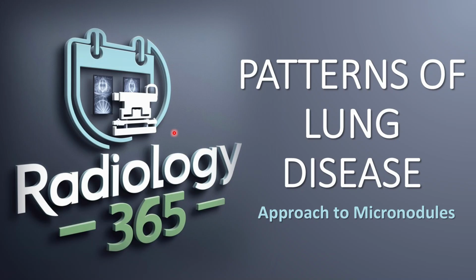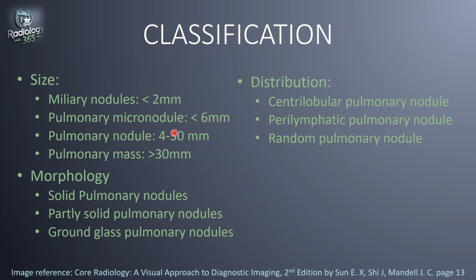And in this topic, we're going to talk about patterns of lung disease, approach to micronodules. Now, when we talk about micronodules in the lungs, they can be classified based on their size, their morphology, or their distribution. When they are less than 2 millimeters, we call them miliary nodules. When they are less than 6 millimeters, they are micronodules. Anything less than 3 centimeters is considered a nodule, a pulmonary nodule. Anything more than 3 centimeters is called a pulmonary mass.